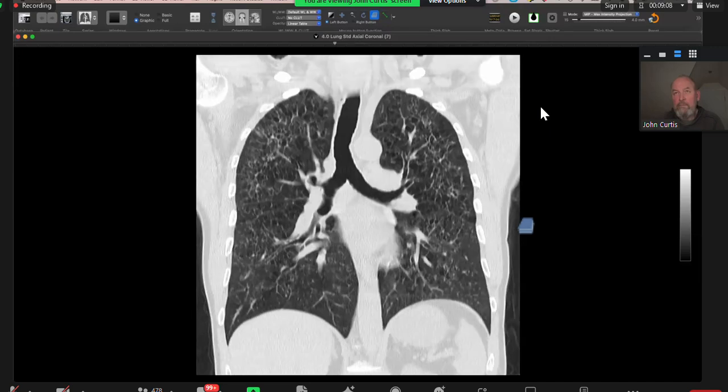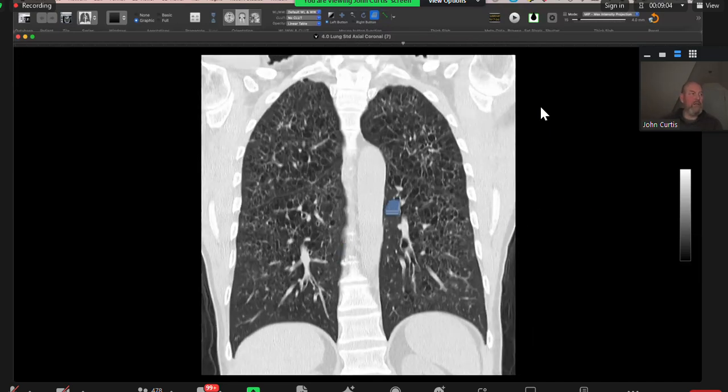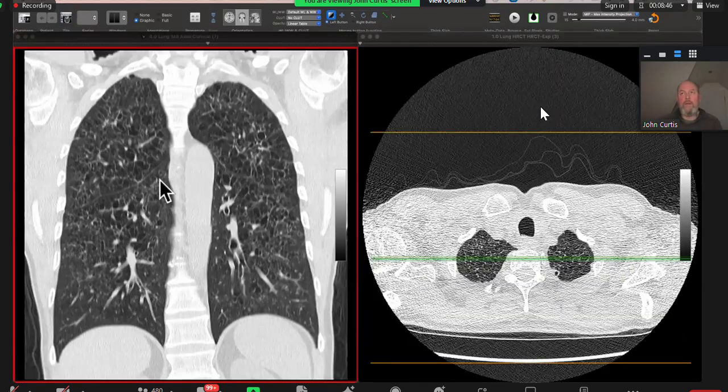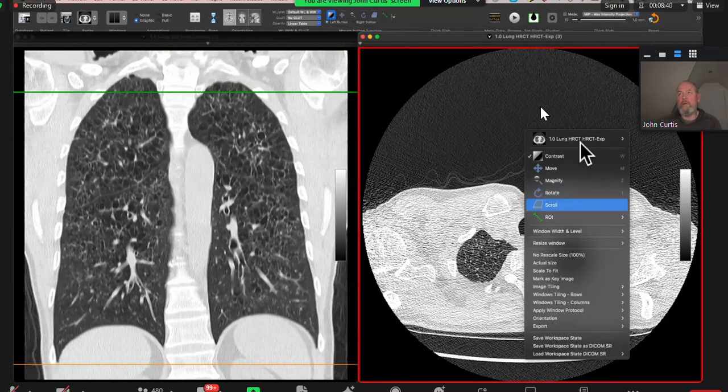I would like to review them on the axial if it is available. Well, I'll show you the axials. Just let me take over for a second. Okay, I'm not moving the mouse. Okay, so you go ahead.